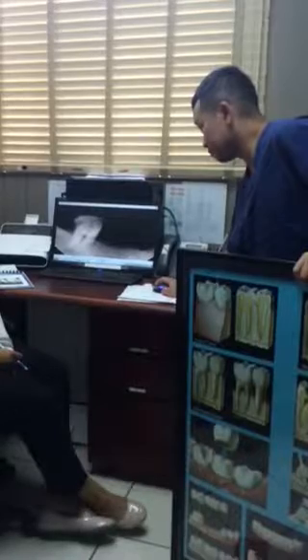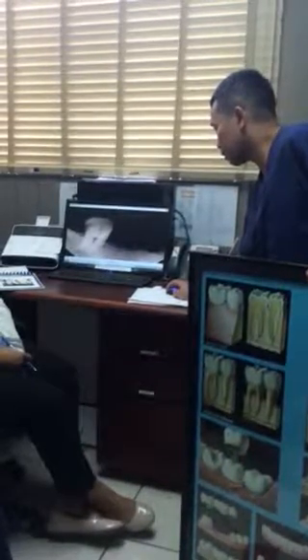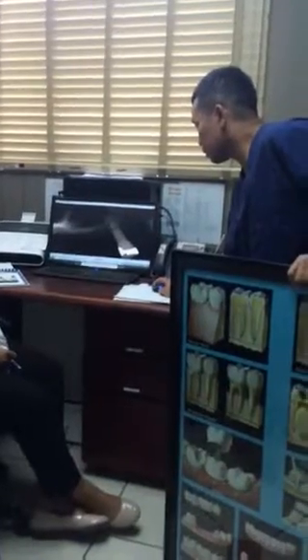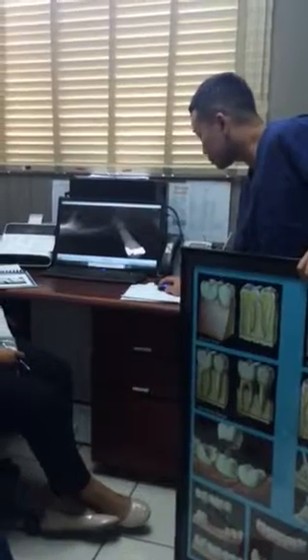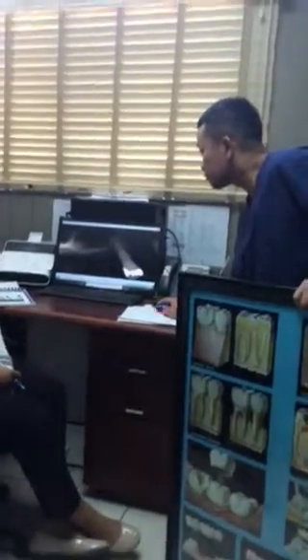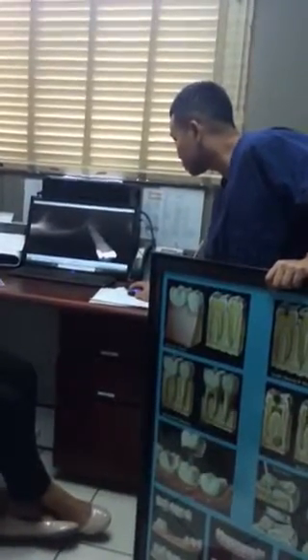Is there an abscess here? No. So we're almost looking at the consistency of the gray area? You're looking at how white or dark it is. Is there an abscess here? No. There's nothing here. This is just denser bone. This is their natural bone right here.